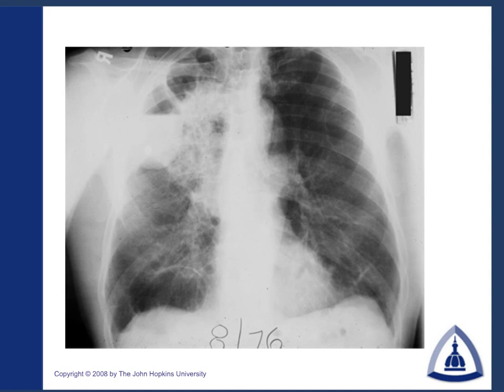He had pneumonia here in the right upper lobe, but what happened was one of the bullae filled up with fluid, and this isn't really an abscess, it's just an effusion or fluid collection that filled one of the bullous lesions. He was treated with antibiotics, and all these resolved. Okay, so the important thing here is that we had an X-ray from before, and we see that all this bullous disease was present, and when infection presented itself, we now see it filled up with fluid.